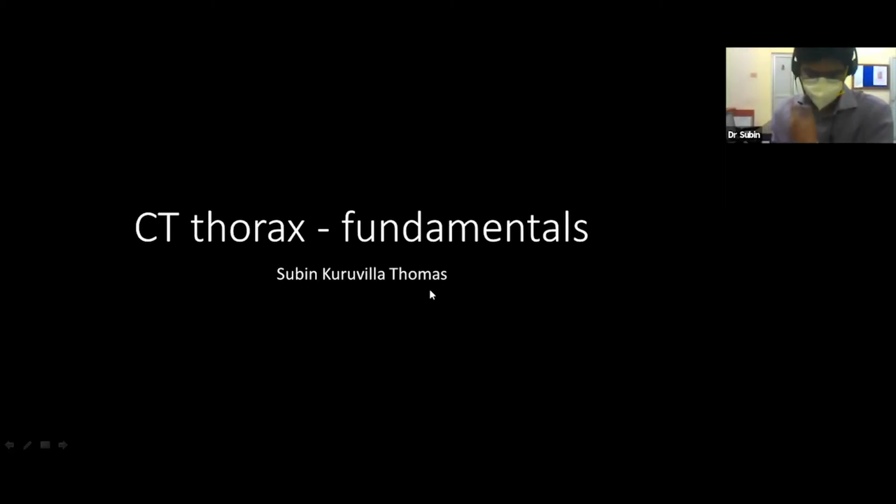Hi. So I'll be talking a bit about CT thorax. Just the basics. I'll go through how to run through the CT thorax, what the basic things are that we look at, and maybe go through some pathologies which we try to identify on CT.